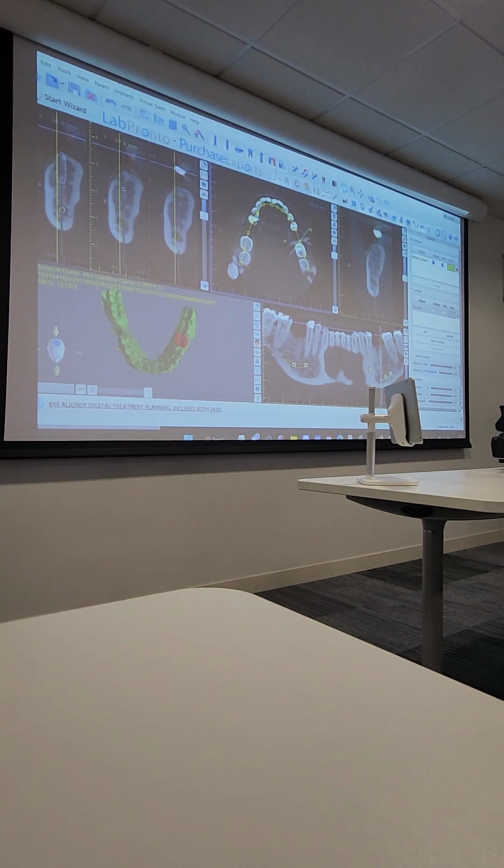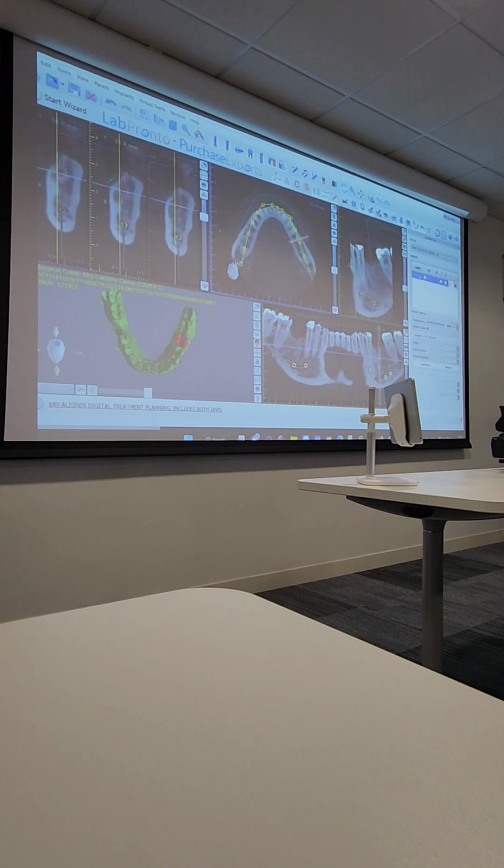Isn't that kind of small on your panoramic? If you go to your implant list, on your right hand side, do you remember the panels? Go to your implant list. There is an implant there now. Got it? Press on the implant. It will line all the windows to your implants then.